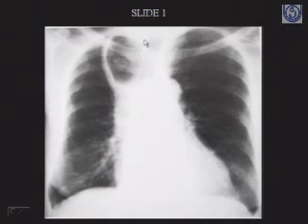So in this, the air of the esophagus being overlapped onto the lung parenchyma gave a spurious picture of a cavity in the right lung field. But that has been cleared by the barium swallow. So in total, if you go retrospectively, you find this was the wall of the dilated esophagus, and that was the air in the esophagus. This is the dilated esophagus, which is filled with fluid, and the reason for that was the narrowing of the lower end of the esophagus.